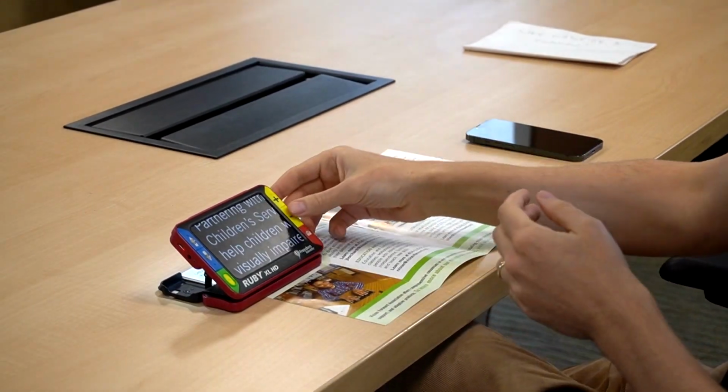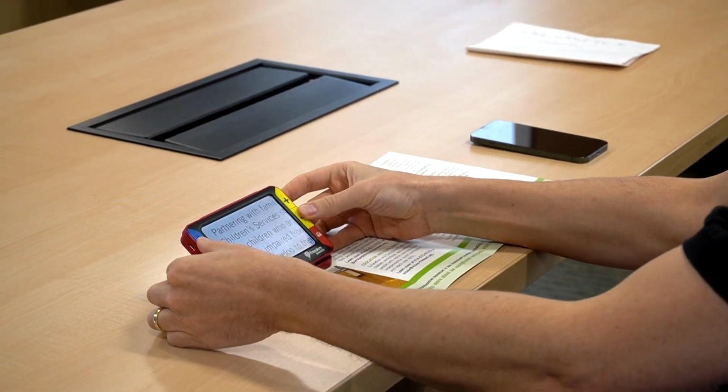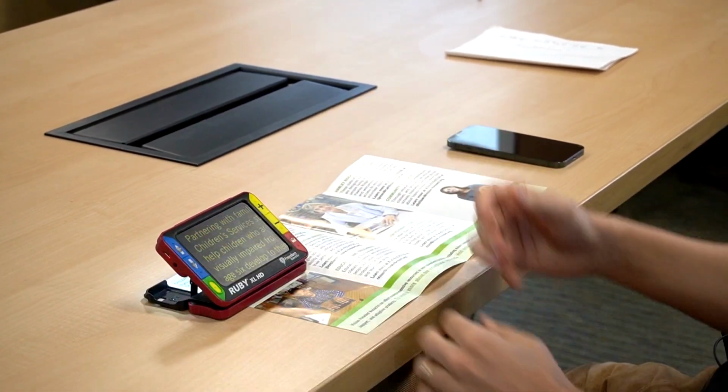But if you do find yourself struggling using a phone for some of these reading tasks, there are dedicated devices which generally are going to do a much better job. They are electronic magnifiers, or CCTVs, and here I have one which is a handheld unit, and with this I can just place it on top of my reading materials rather than having to hold it. And as I'm reading, then I will slide the magnifier left and right. And we have all of those same types of features in terms of changing the magnification, changing the color scheme, changing the screen brightness, and all of those different things.